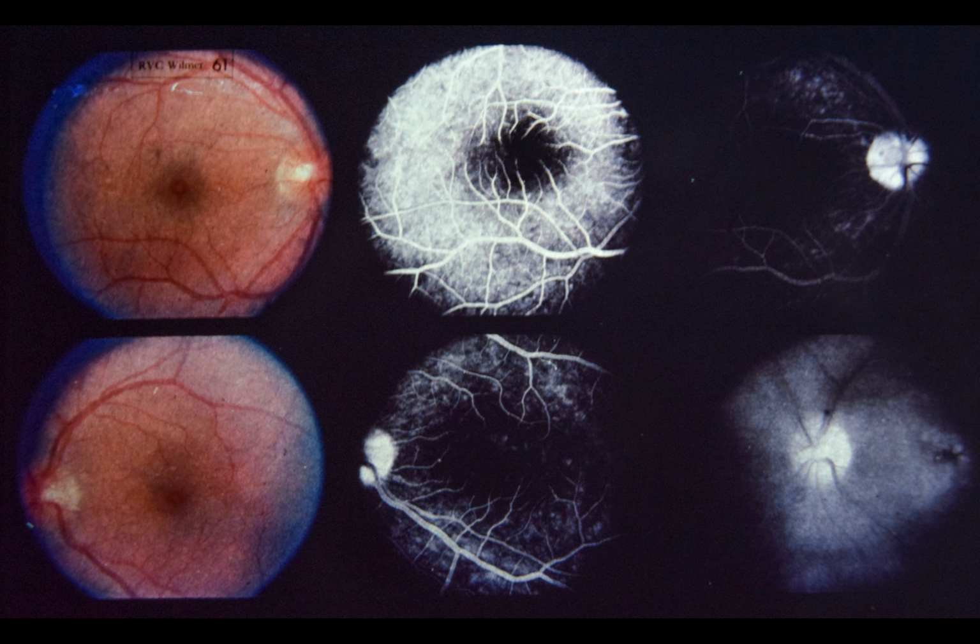Comment: This patient demonstrates retinal vascular leakage without other evidence of intraocular inflammation. He has been treated empirically for symptomatic loss of vision in the right eye, but has never experienced nor had recorded visual loss in the left eye. Nonetheless, there is unequivocal angiographic evidence of bilateral retinal vasculopathy in the form of cystoid macular edema.